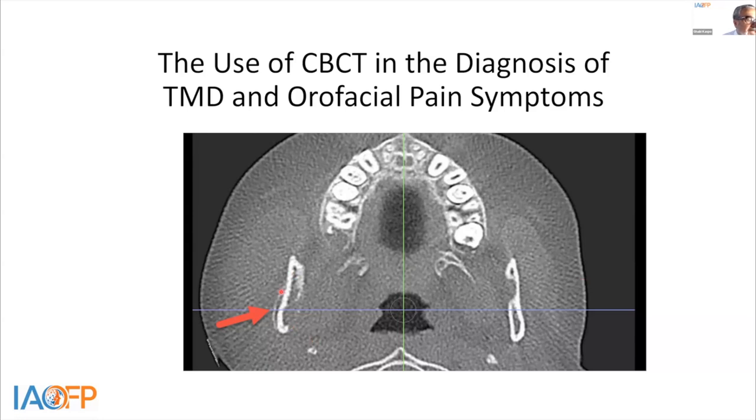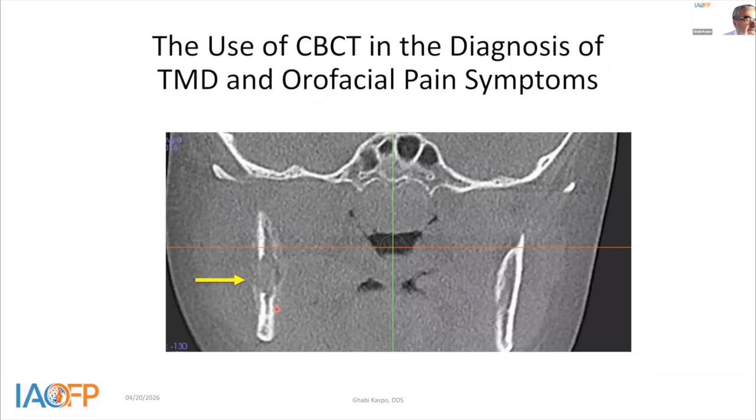When you see a double image of the bone, and you see some loss of bone and some widening in the bone, some different layers, that means this is very clearly osteomyelitis. So the patient was referred to infectious disease at the hospital, and they treated her. I don't have any information.